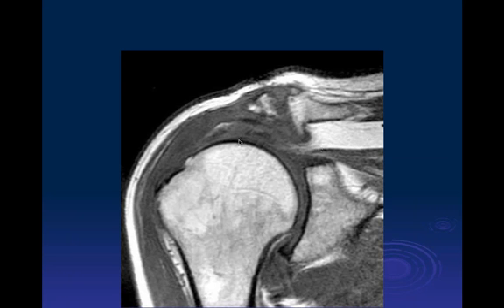We're actually a little bit posteriorly near where the supraspinatus and infraspinatus should be. It's a T1 weighted image because we're primarily looking at the bones in this particular case. What we see here is a very abnormal shape of the acromion. That's because this patient's had a very large acromioplasty. But what we see here is that there's a very large osteophyte in the distal clavicle, which is in a position to create high risk for impingement, which was left in place. And this patient actually has a rotator cuff tear in this area that we could see better on the other sequences.